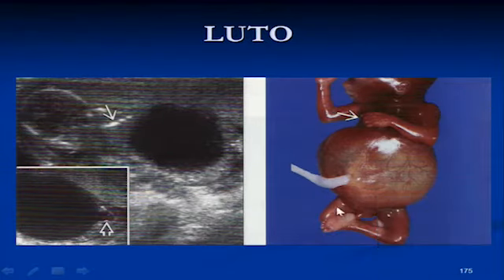As I said, if you leave that going, then the bladder can become so huge that it will stretch the skin around it and will cause the prune belly syndrome. Now, the bladder outlet obstruction or posterior urethral valve only happen in male fetuses. So if you see that in a female fetus, then it's what we call a primary prune belly rather than secondary due to urethral obstruction. This is just a catheter. You can put that catheter in the bladder and you can drain it.